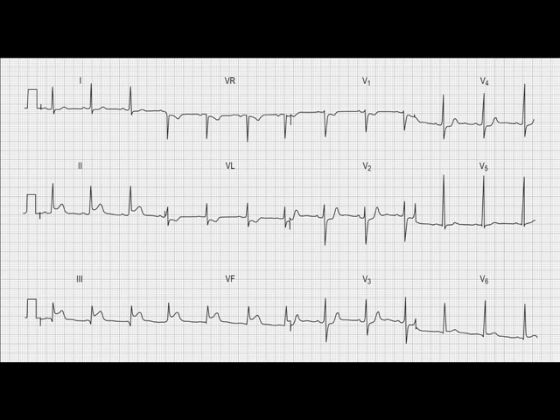Let's look at the limb leads. We'll look at those on the left of the ECG. We see AVR, or VR as it's labelled there, is negative as it should be, inverted P wave and T wave, that's fine. And I'm not certain whether lead 2 or lead 1 is the tallest, but that's fine. Lead 3 isn't quite so tall. And the chest leads progress from negative in V1, sometimes labelled C1, to positive in V6, sometimes labelled C6. And V5 there is the tallest, which you often see.